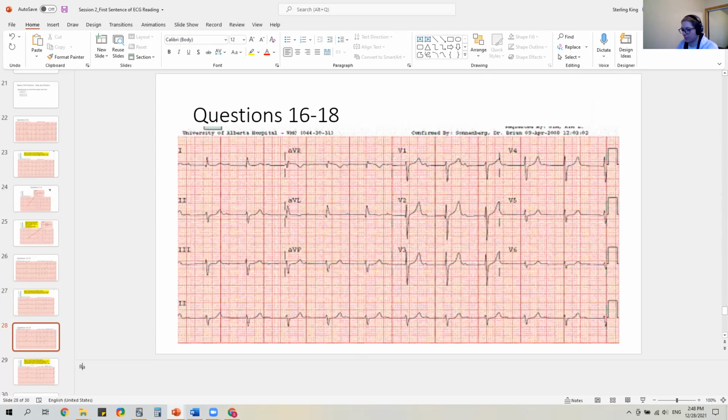All right, so last one. All right, so rate. We could do the 10 count this time. So 1, 2, 3, 4, 5, 6, 7, 8, 9, 10, 11. 11 by 6 is 66. So that's normal. Let's come back. Let's do axis first. This one's going down, this one's going down. So this looks like a left axis because only the one is up and the other is down. So again, 2 is down, aVF is down. This is the left axis.